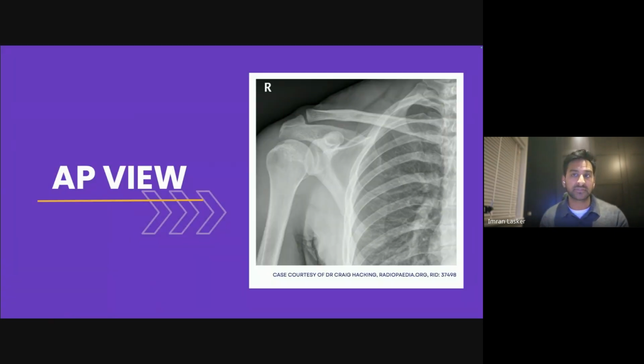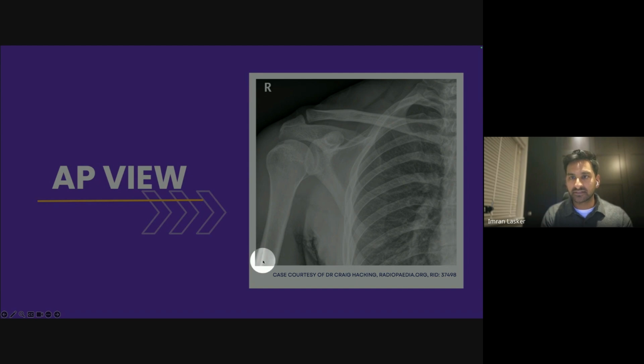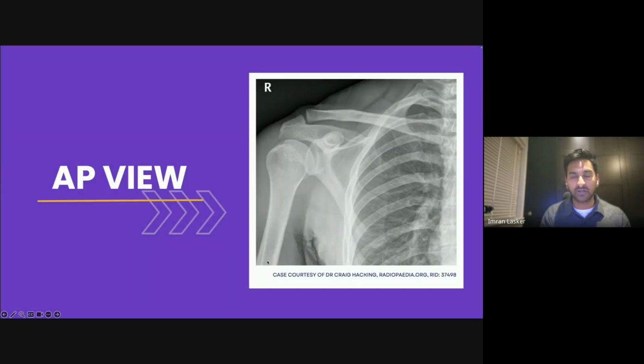If you're thinking that something's a fracture, but you can see it getting more and more sclerotic, more and more white as you get to the edges, then you're not looking at a fracture, you're probably looking at a normal structure. And these can be vessels, grooves, all sorts of things. So for example, this one, you can say, oh, that could be a fracture. But when you really take a look at that, you can see it does get a little bit sclerotic as you get to the edge of that line, and then another line appears. So this can't be a fracture.